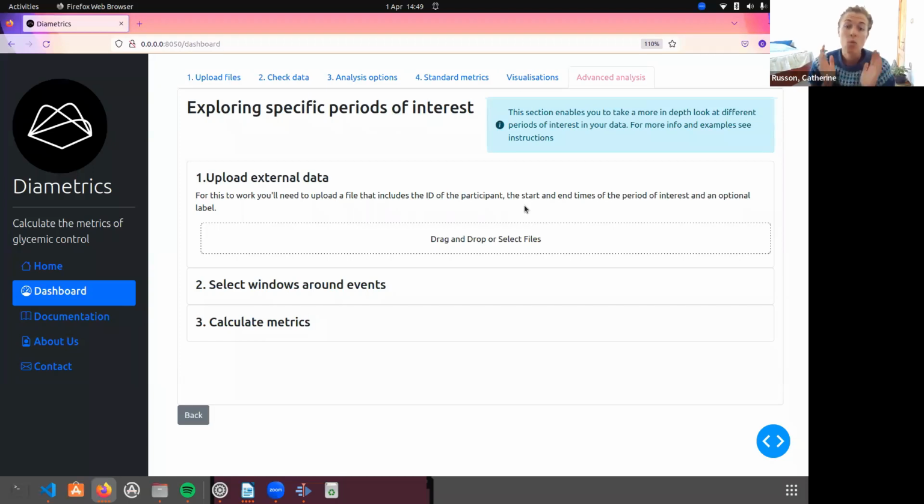It can either be one column with start date time, so the 14th of the 9th, 2022, and then 0130 for 1:30 or something like this. You can include seconds as well if you want to. And the end date time can be the same. Alternatively, you can divide both of these into start date, start time, end date, end time. Another alternative is you use either start date, start time, or start date time, and a duration in minutes. So those are your different ways that you can fill in this information.